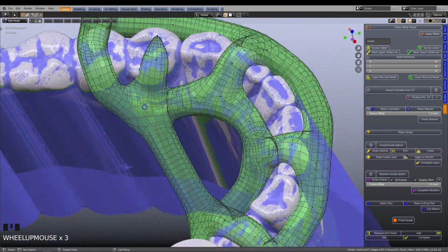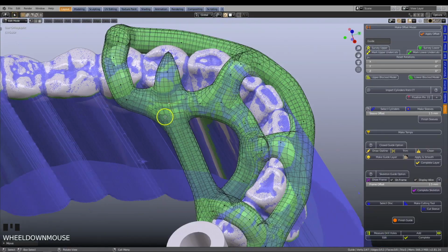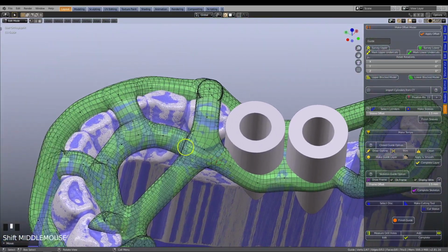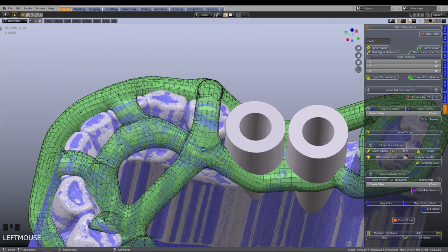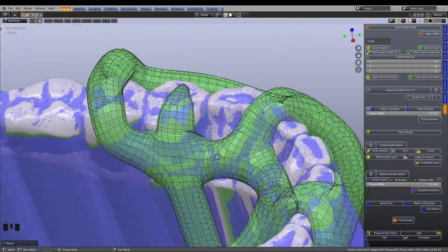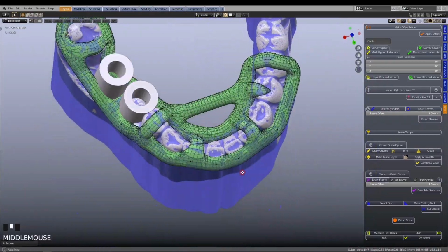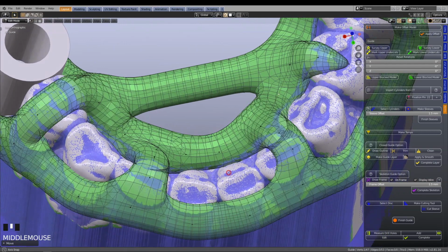Then, place the mesh into a more relaxed state. Something like this. There are many possibilities for your design. Continue to readjust the joins, until you are satisfied with the outcome of the frame. Double-check the frame, to see that the attaching surfaces are adequate.